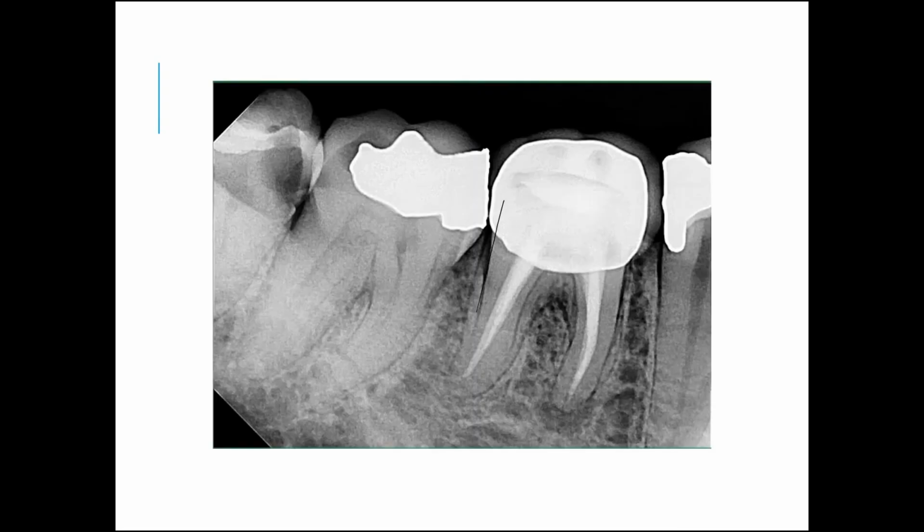Here is a radiograph belonging to the mandibular left back tooth region. The teeth that we can see here are partially seen 35, then here is 36, then 37 and 38. Let's consider 36 as the tooth of interest. So, according to what I have already mentioned, first we have to interpret the crown part or the coronal part. Here you can see the entire coronal part is covered by a radio-opaque structure suggestive of a metallic crown.